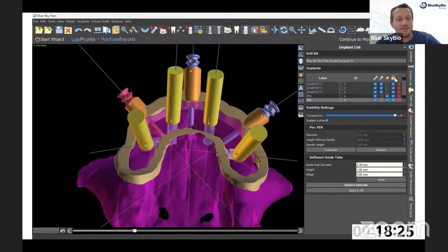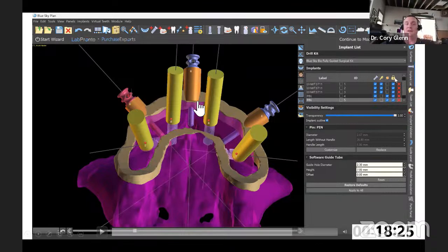Oh, truth is, I'm thinking out loud, we actually have new functionality to combine surfaces in BlueSkyPlan. So one way you could combine your tubes here, but what you'll run into is the hole's going to be filled in right here because remember, this is solid.